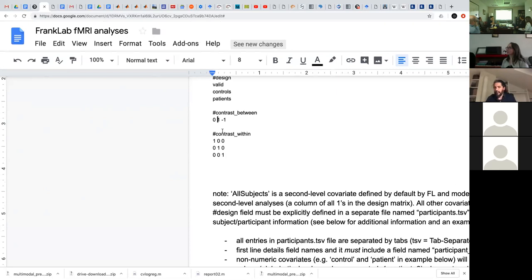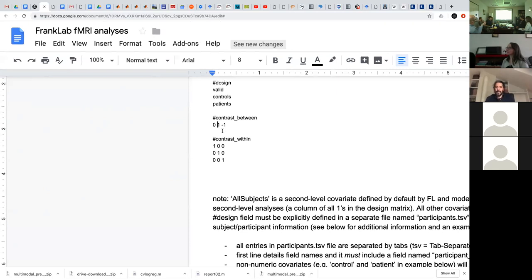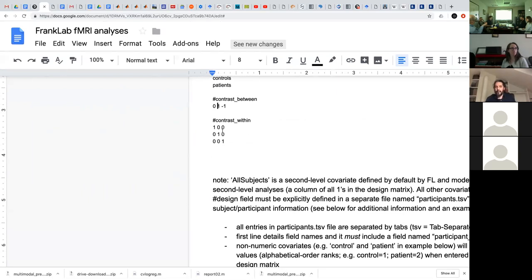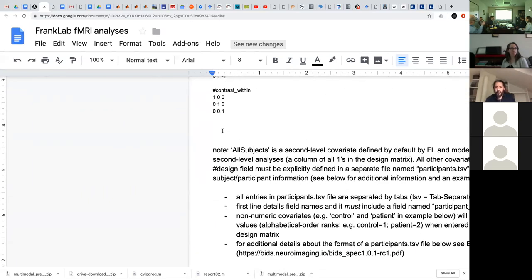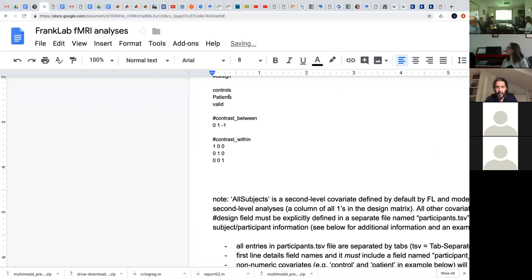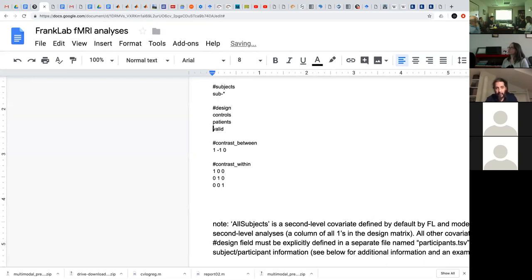Yeah, that makes sense. Okay. Is there something about valid because of where it is in the order? No, the order is just part of the valid. If you list it right, that's perfectly fine. If you list it in here, that will be right. I mean, these are basically the contrast across whatever you specify up here, in the same order as you specified up there, right?